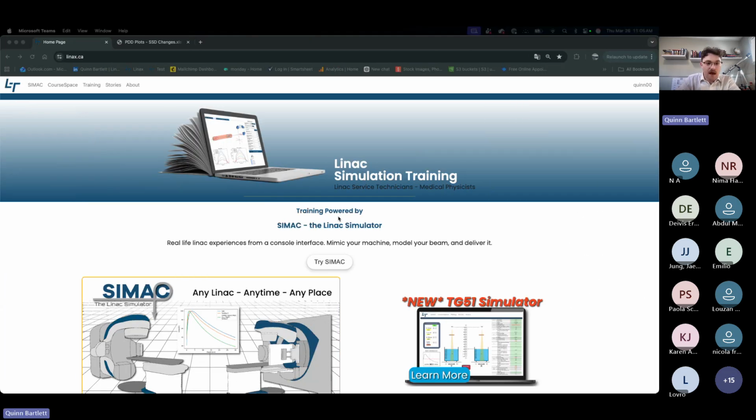So I'm going to take us to the platform, and really where I want to start is, before jumping straight into the simulations, I want to imagine we're approaching this topic as somebody who doesn't know it, learning it for the very first time. And I want to show how our platform facilitates that. In a classroom setting, we might have an instructor assign some readings and some labs to do, but if we're on our own, where we really want to start is our student resource portal.